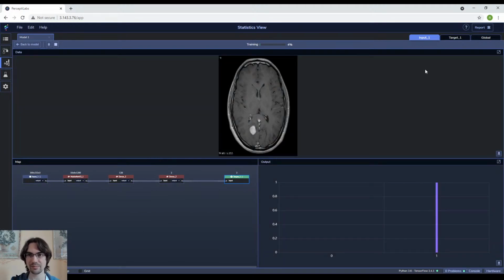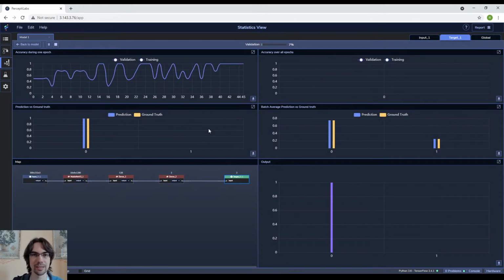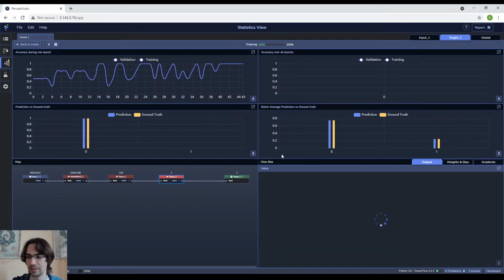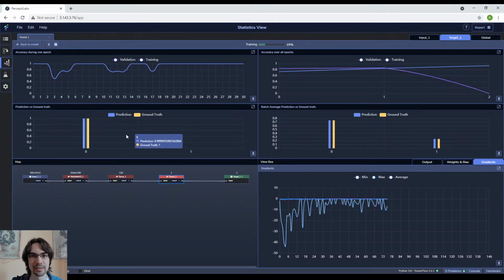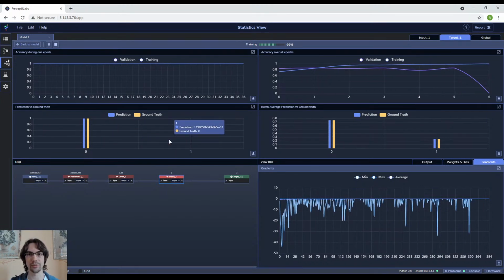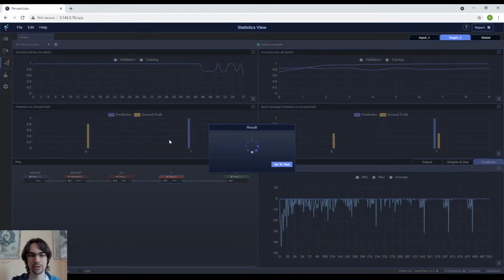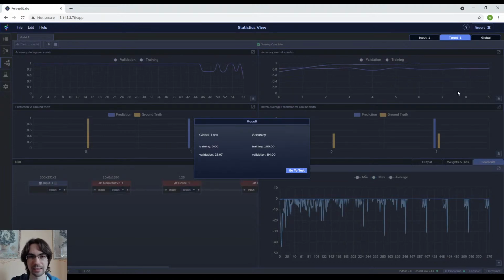There we go. After this, we can try the VGG again and see if adding or just training it a bit longer will make any good difference. We're also seeing that pretty much all samples were spot on with the prediction and ground truth. So the model is already really good. As we saw before, it's over 90% accuracy a lot of the time, so there's not too much we can keep improving on.